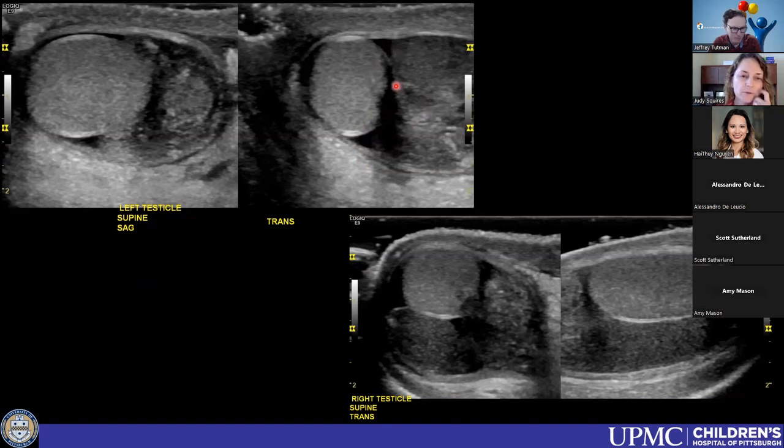Yeah, supposedly, if you believe the literature, as much involvement of the tail as the head can lead you towards a diagnosis of HSP. Obviously, if it's bilateral, but sometimes that's not helpful. Sure. I feel like sometimes infectious epididymitis involves the tail as much as the head. Right.